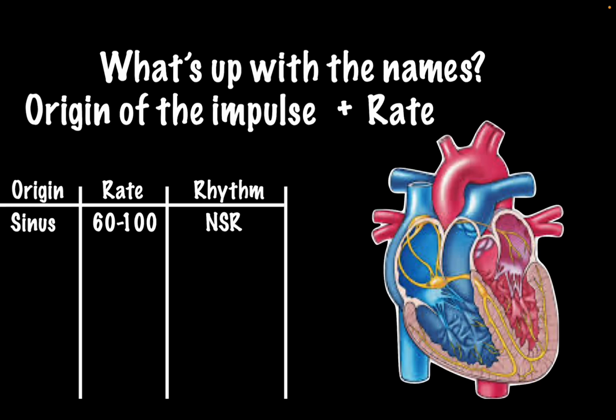Okay, well, let's try another one. Another impulse that starts in the sinus node. The rate is greater than 100. So what's the name for a heart rate greater than 100? Tachycardia. So what's the name of the rhythm? You got it, sinus tach.